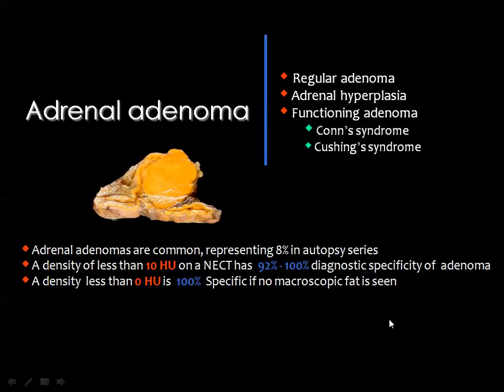And the lipid-rich adenoma is usually of low density on the non-contrast CT images, and it will enhance whenever you inject contrast material, then the enhancement will wash out in the delayed scans.